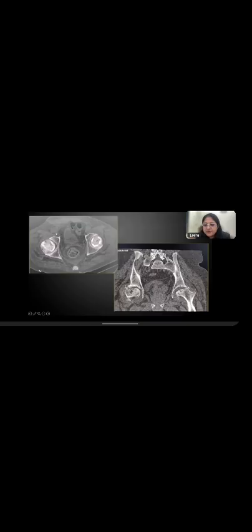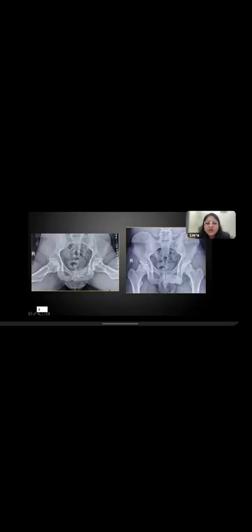See the type of collapse that is happening and the destruction of bone that is happening in the femoral head. So for AVN, this is a much milder case. I will tell you that this is also AVN. I'll remove the chat box also so that you can see the other one. So here you can typically see the subchondral cyst, a little bit of osteopenia, and there is also widening of the neck of femur because there will be stress on the neck as compared to the head. The head is not able to take the load which it is supposed to, and that is why the neck widens in cases of AVN also.